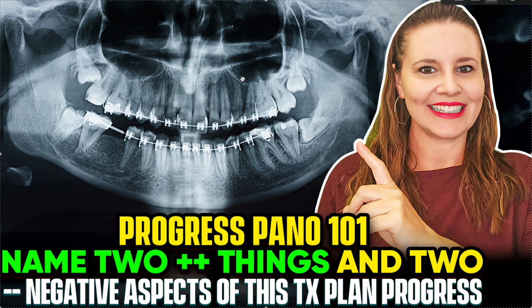And then besides that, what the heck is going on here? Could be an artifact, totally. Could be a ghost image, totally. Probably is. But guess what? We're taking a PA no matter what, just to make sure. And if something shows up in the PA, then we're taking a CBCT and getting it read. So I'm not proceeding even if there's artifacts. You have to have a clean image. You have to verify the clean image. Even if they came in with a pano from a year ago that didn't have it, guess what? Got to be a clean image. Could be a new situation.